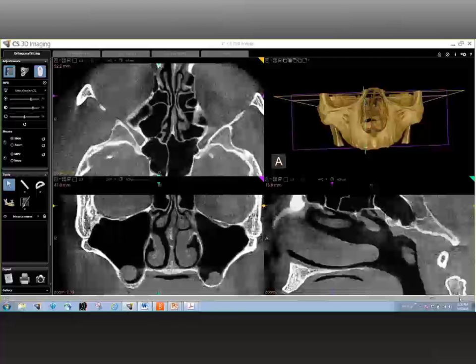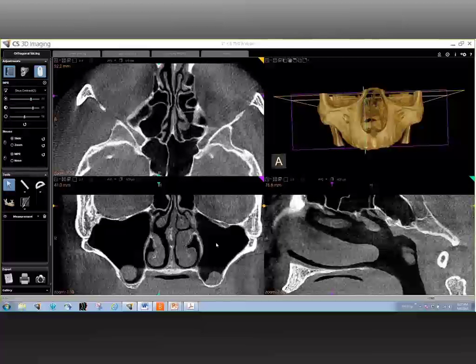But in this case, you're able to see soft tissue contrast within the sinus because the sinus generally has to be black, because it's nothing but air that's in there. So in that background, there's enough contrast for the soft tissue structure or the soft tissue pathology to show up. And that is the only reason you are able to see sinus pathology.